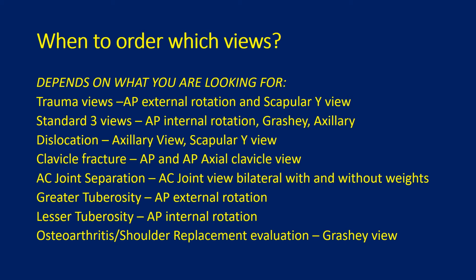Well, it really depends on what you're looking for. The standard trauma views are the AP external rotation and the scapular Y view. The standard 3 views of the shoulder is typically an AP, either internal or external rotation, the Grashey view, and the axillary view. For dislocation, I prefer the axillary view. However, sometimes a scapular Y view is easier to obtain.